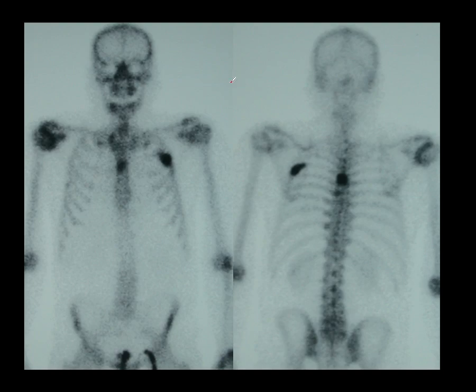So you might have seen it on some of the pictures I've shown earlier, but sometimes if there's an area of intense activity on, for example, the posterior view, the gamma rays which are emitted from the tracer, from the focal area of accumulation, will in addition to activating the posterior camera head, also pass through and activate the anterior camera head.